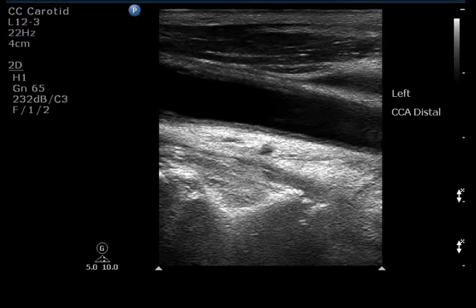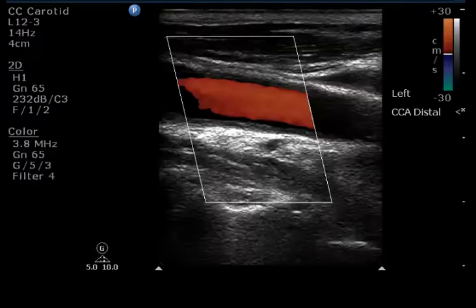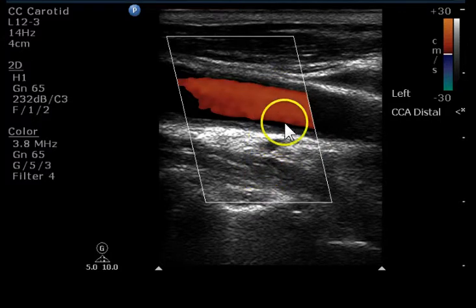Image of the distal common carotid artery on the left, perhaps a little bit of intimal thickening here, but no plaque evidence. Well, perhaps a slight amount of plaque. It's hard to tell whether this was frozen during systole or diastole. It's always important to freeze an image during systole. This is when the flow disturbances show up. This is when aliasing shows up. And this is when we get the most sensitivity for determining whether or not this is just slow flow that's outside the range of our Doppler PRF, or whether this is really plaque.